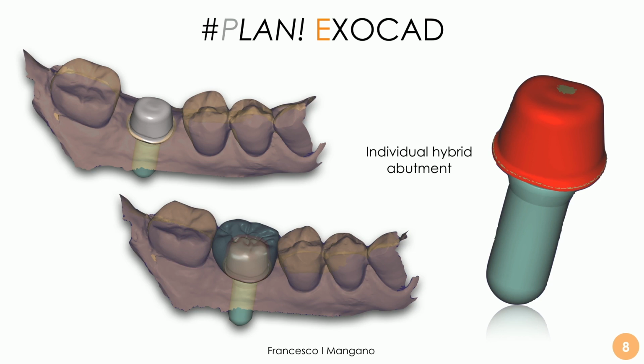And then the dental technician can model on an individual abutment. The upper portion of the abutment is modeled for milling in zirconia. And it's very important to carefully model the whole individual abutment, particularly the upper and the lower portion. They have a lot of tools in this software, Exocad. They have a lot of tools and operators in order to model exactly as we want, individually, in order to fit the needs of that specific patient, aesthetically, functionally, and biologically.